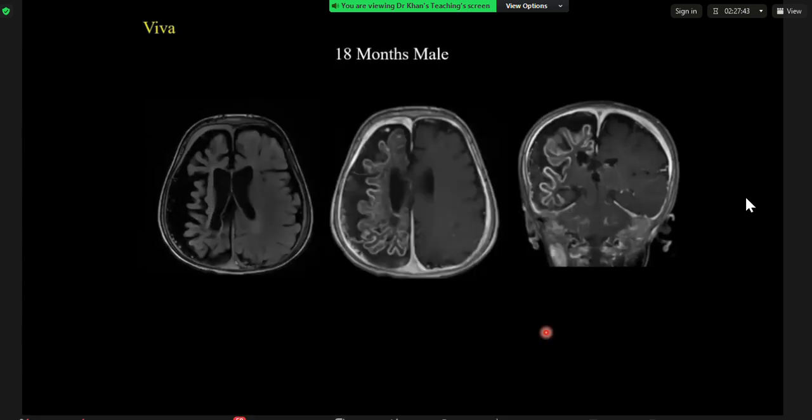So I'm just wondering whether we are dealing with some vascular disorder with the insult to the brain, resulting in the microcephaly on this one side, and for example, in Sturge-Weber syndrome, increased vascularity, and probably there was some old blood hemosiderin deposition, and I think I'm mixing the two concepts up. But the pattern recognition is more of Sturge-Weber syndrome.